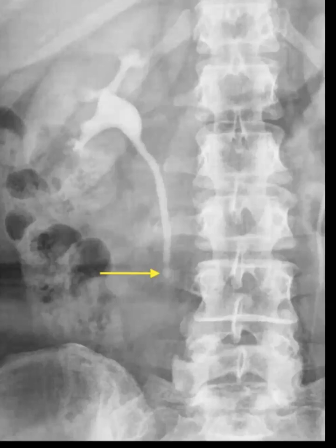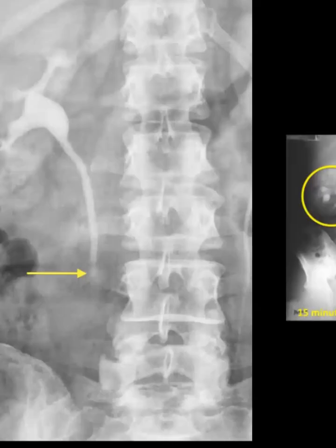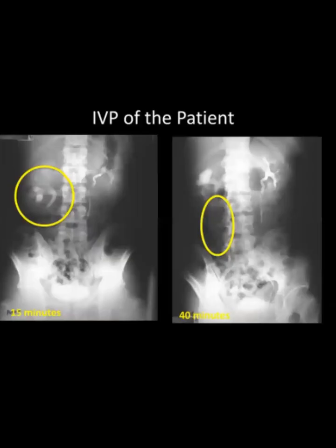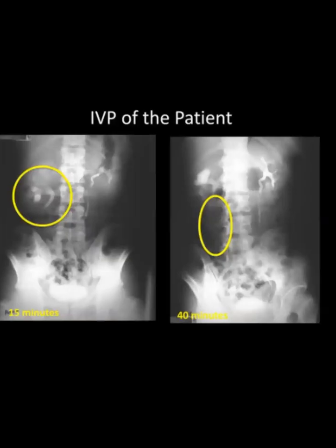What it is showing is an intravenous urogram. So what it is showing is a right sided radiopaque stone, level of obstruction, and dilated pelvis and calyceal system. So here you can see both the right and left kidney. You can see that there is a defect that can be shown at the PUJ or just in the proximal ureter.